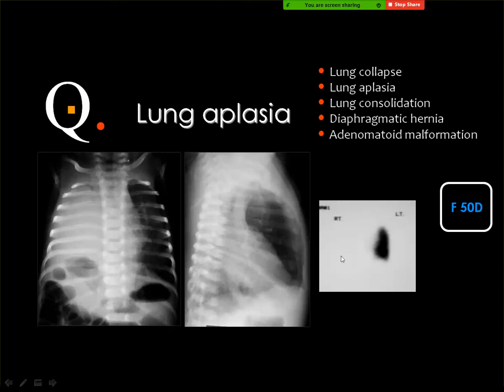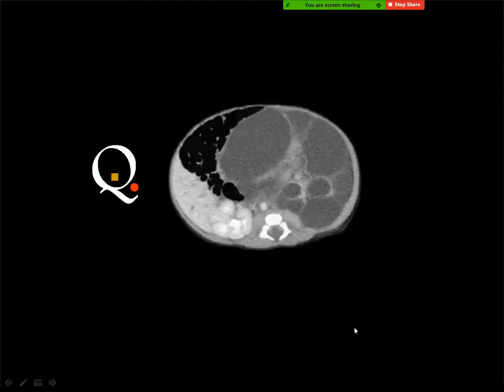But without this image, you may say that this may be a pleural effusion and maybe a hypoplastic lung, but you cannot see the aeration. There are many possibilities for this. But whenever you do not see any perfusion, you know that the lung is not there.